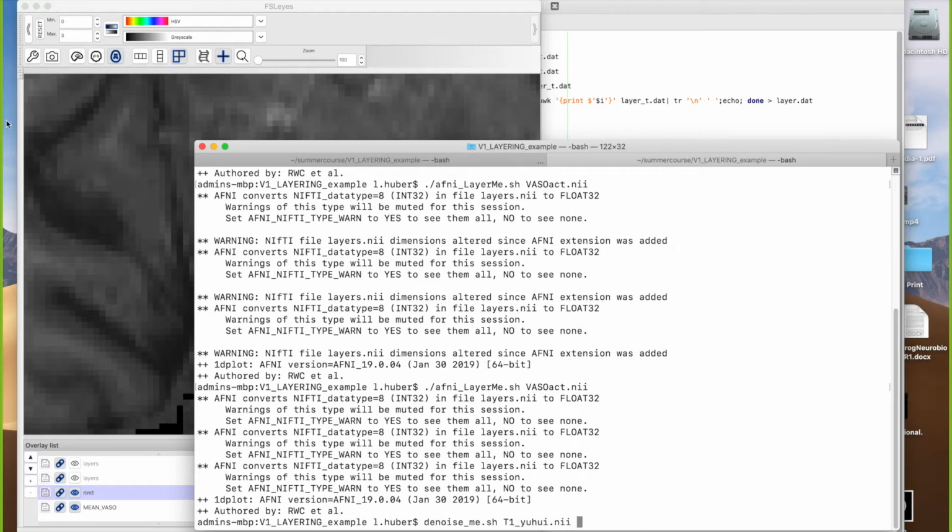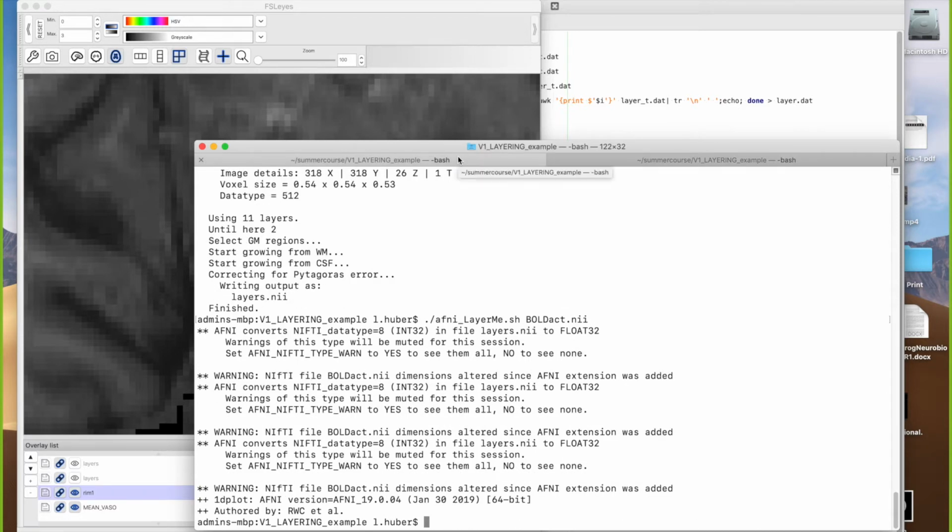All right. For completeness, let's do it for those who have LAYNII versions. Renzo? Yes. For me, it actually says that the ln grow layers command is not found. Okay. This might have multiple reasons. You can navigate to the folder of the LAYNII and then run the command there. Yeah, no, I did that, but then it still gives me the same error. But I can then put ./ at the beginning of ln. Okay, I'll try that.